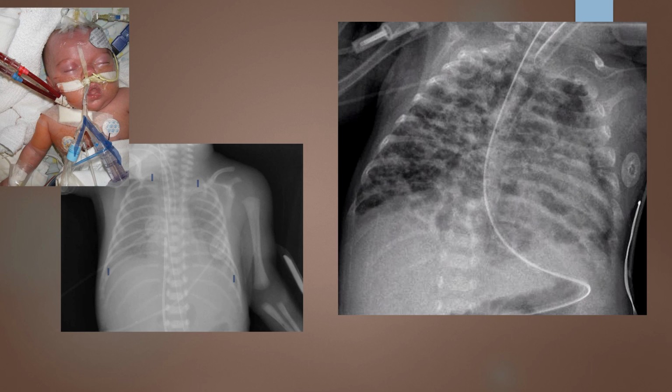Here I can see that we're going to look for symmetry between both sides of the lungs, and it appears that this baby's right lung is a little bit larger than the left. That would indicate that the spine has moved to the left, so that patient then would be in a slightly rotated LPO position. If we go up here and we look at these little bitty clavicles, here's the sternoclavicular end, here's the sternoclavicular end, and you can see again that it has been moved into an LPO position. So those two findings support one another.